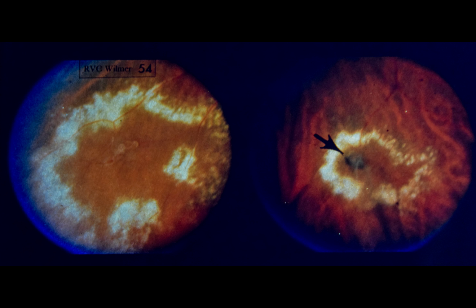Fundus examination left eye disclosed a normal posterior pole and 2 areas of circinate retinopathy inferiorly. On the left, note aneurysmal dilatation of vessels passing through center of larger lipid ring. Remember that entire area within lipid ring is edematous. On the right is second lipid ring, located 3 disc diameters nasal to circinate pattern seen left. This lipid is also located in middle layers of the retina.